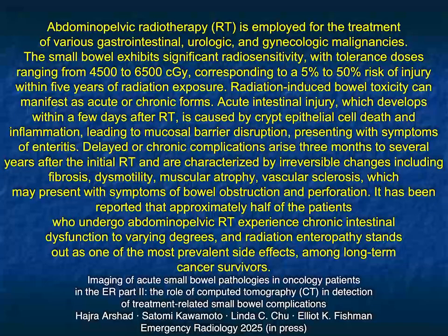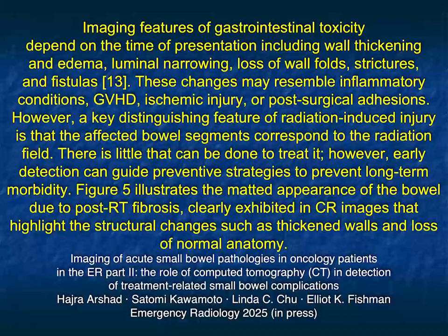Where the radiation ports are, you often can see that. You can see involvement of the kidney, liver, pancreas. But again, the frequency of radiation-induced complications is substantially lower than it was in the past.